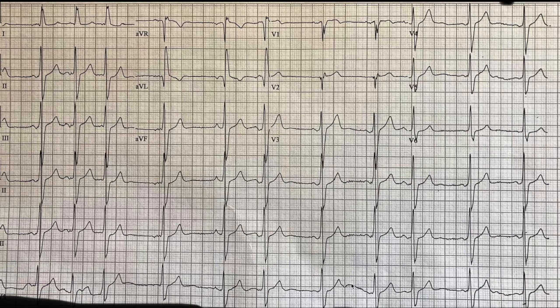And hopefully that's given you enough time to walk through this thing. Let's go through our standardized approach to them so that we don't miss anything. Looking at this EKG overall, nothing sticks out at me right at the beginning where my eyes are drawn to, so let's walk through it. First, rate. Let's look at rate here.